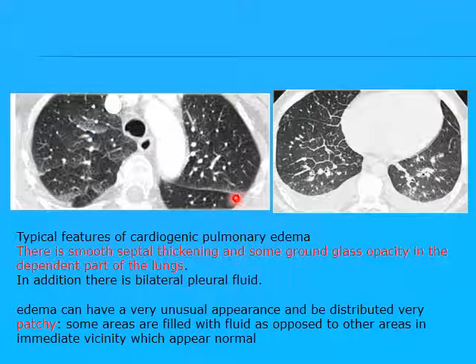Number 2, there is a smooth thickening of the pleural fissure. Number 3, there is, as you see, interlobular septal thickening, bilateral and diffuse, and more in the dependent areas, in addition to pleural effusion. And you can see cardiomegaly. Actually, in this image the heart is not that enlarged, but it may be an internal defect within the heart causing venous congestion of both lungs.